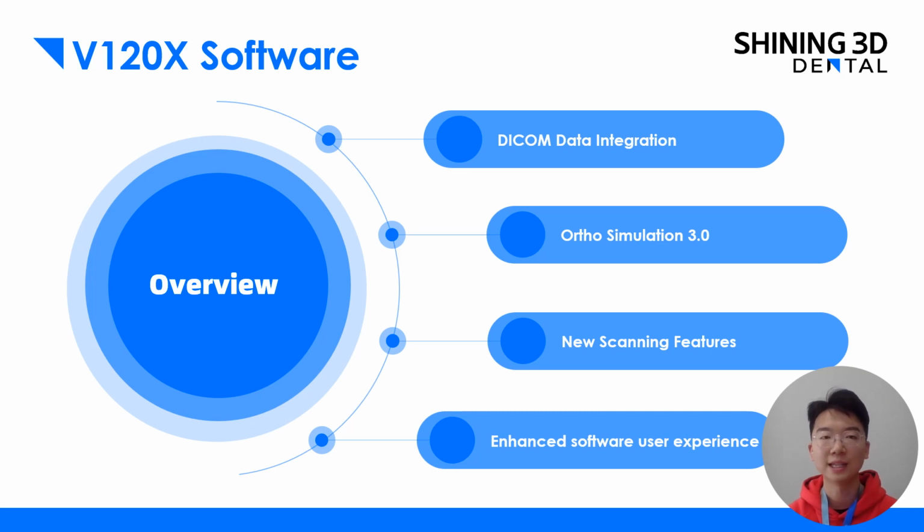Okay, now let's start with the version 120X software. The new scanning features. We will introduce some features updated for the scanning specifically.